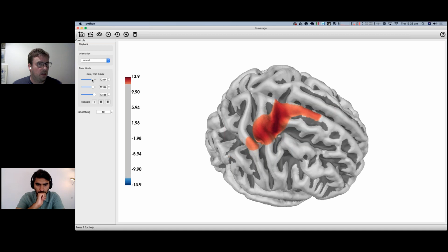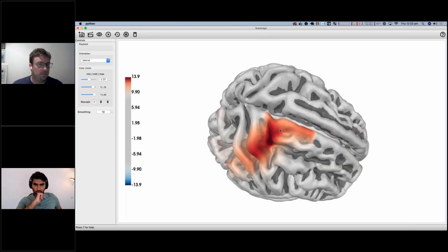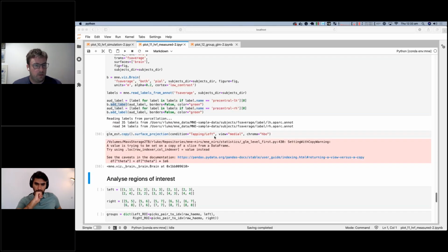This is just a way of taking the closest surface to each channel and projecting the response there. But it's the first step on the way to a proper photon migration analysis. I think it still helps to represent that most of the activity was on the right side of the brain. So there are 3 or 4 different ways that you can look at your channel level data.